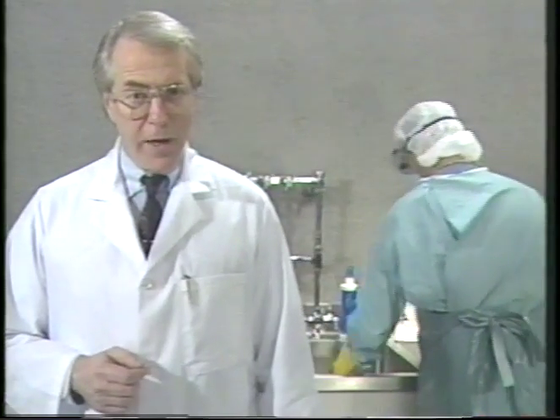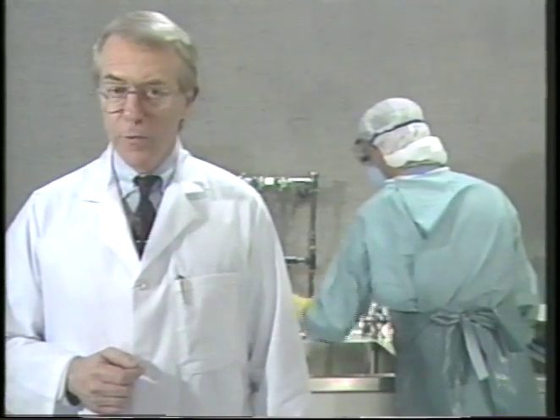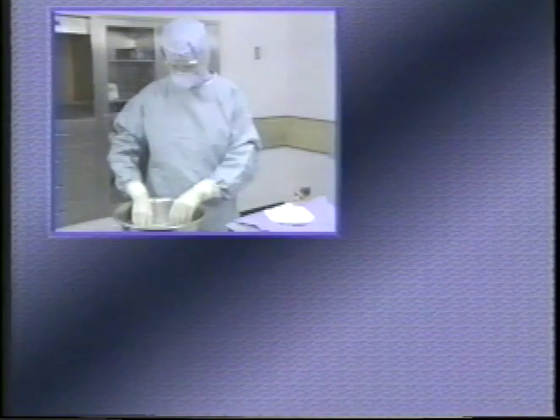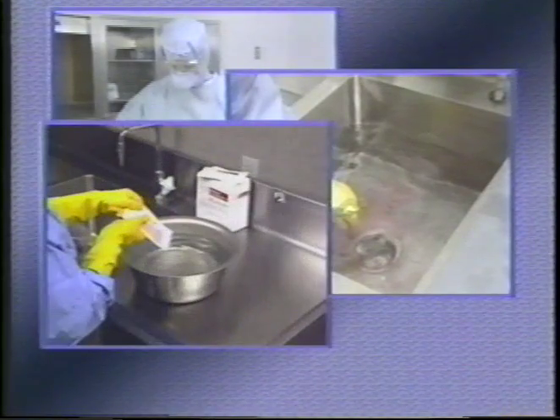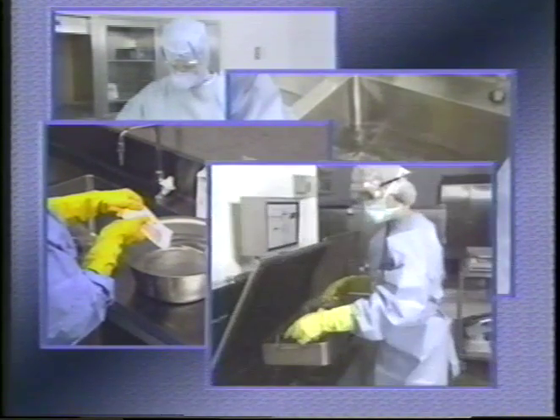Our perceptions regarding what is truly clean differ from one person to another. These different perceptions are often influenced in part by what we're cleaning and how we perceive its value. That's what makes cleanliness so hard to define. That's also what makes it so important. Cleaning is defined as the removal of soil containing microorganisms or inorganic debris adherent to surfaces by a process such as washing with water and detergent.